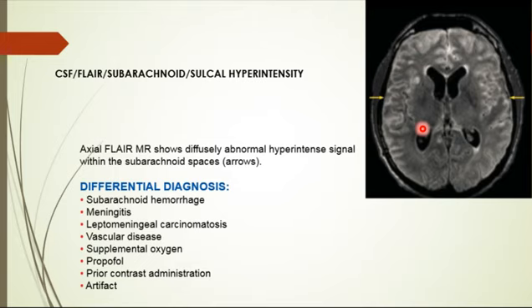But you see it is an artifact. When you see it, if someone doesn't know this is an artifact, they can think of PRES, posterior reversible encephalopathy. It's just an artifact. I know it because it's my machine. I see it in all patients, so you have to correct it. Alhamdulillah, I solved this problem, and now I have proper CSF suppression.